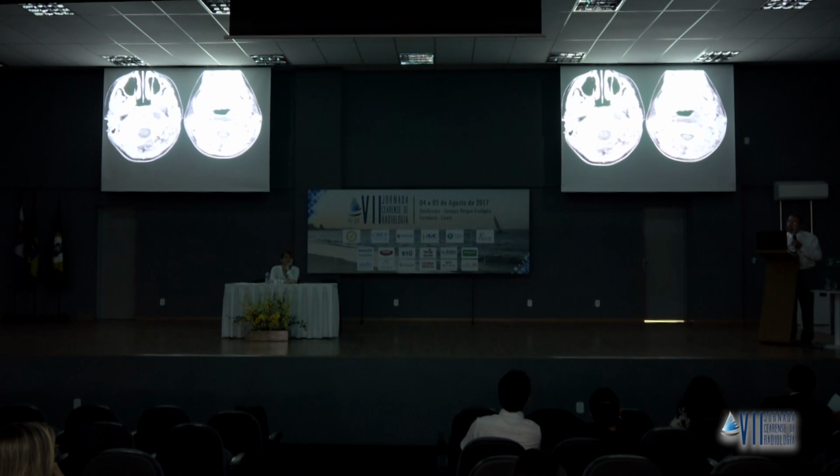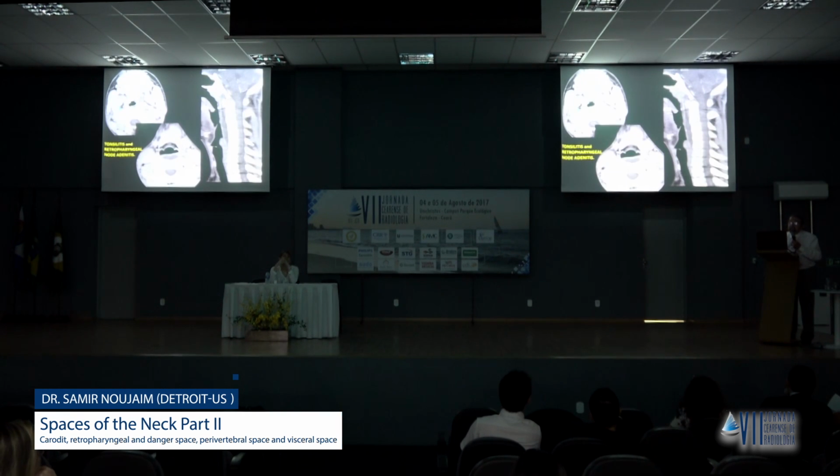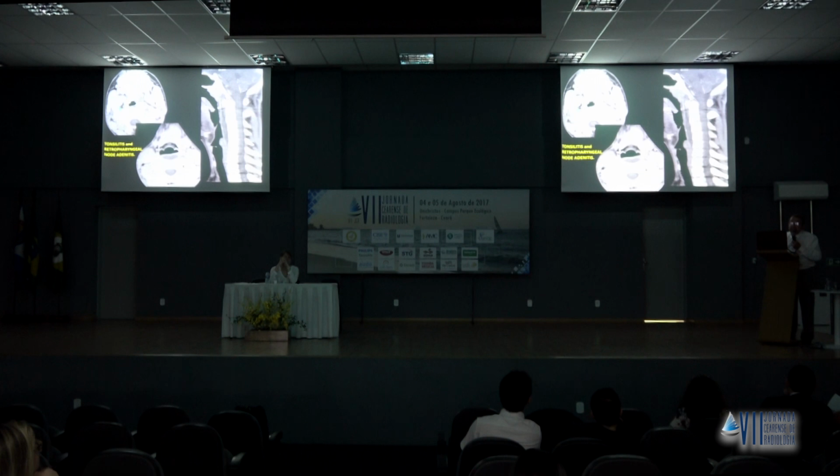So never mistake this for a retropharyngeal abscess. On the sagittal view, you see marked thickening of the retropharyngeal space in another patient that had a lymph node infection from drainage from infected palatine tonsils.